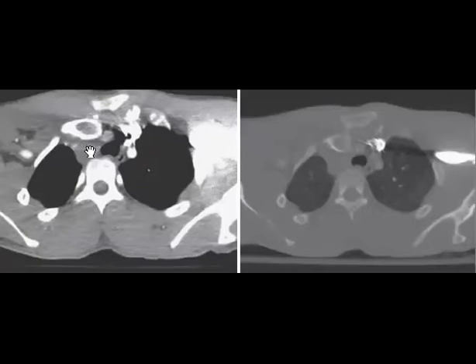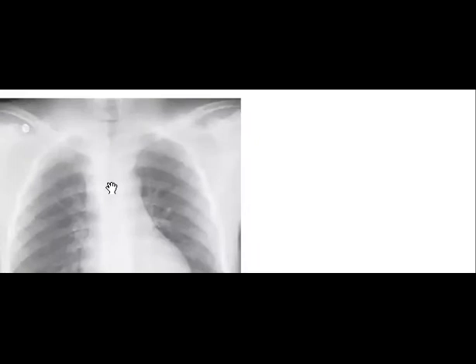They mentioned that the anterior dislocation is much more common, but the posterior dislocation, as in this case, is more dangerous because you have the great vessels behind the sternum. So it is much more dangerous to see if there is any vascular or mediastinal structures injured, like trachea, esophagus, whatever. If you suspect it from the X-ray, the most important thing is to request the CT with post-contrast.